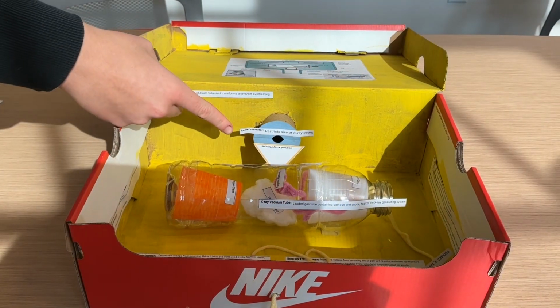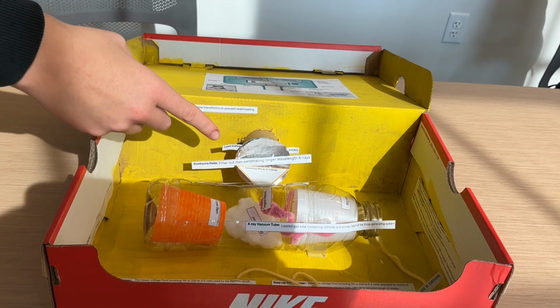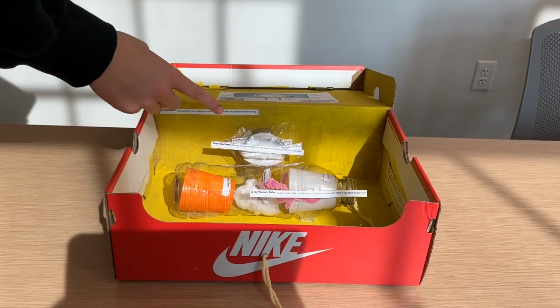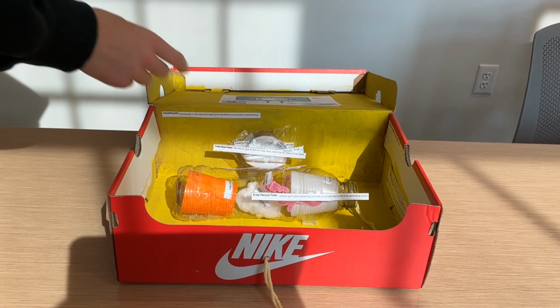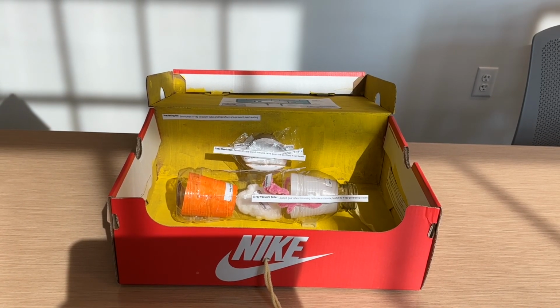This is the lead collimator, and it restricts the size of the X-ray beam. These are the aluminum discs, and they filter out non-penetrating, longer wavelength X-rays. The clear saran wrap represents the tube head seal, and it permits X-rays to exit the tube head, seals the oil, and filters the X-ray beam.